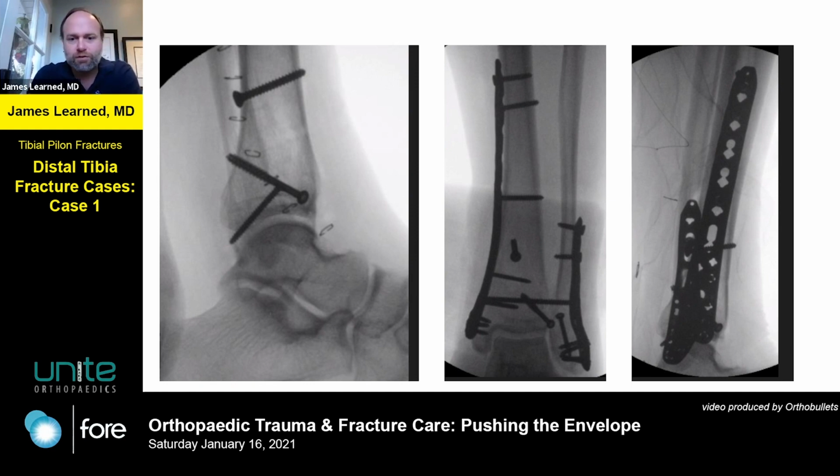As we've skipped around, there is no external fixator. So this was fixed acutely. And I think that's part of it, recognizing the mechanism, the energy level of the injury, and then the soft tissue injury.